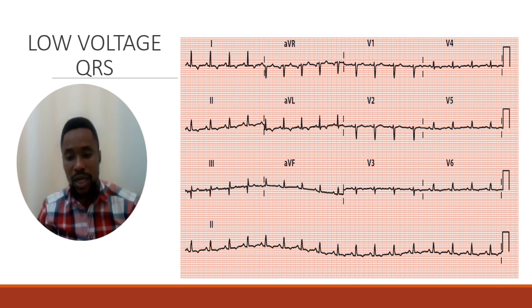You can see this mark here. So I'm saying from here to here is AVR. From this line now that you are seeing to this end is your V1. So from this line to this line is your V4. This is the calibration sign.